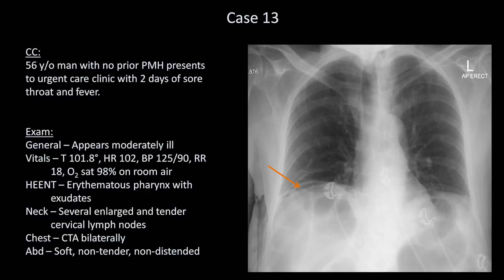It kind of looks like the patient may have free air under the diaphragm, that is, pneumoperitoneum, which is often indicative of a surgical emergency. The first clue that this is not pneumoperitoneum has nothing to do with the X-ray, but rather the clinical scenario. The patient is not presenting with any abdominal complaints. So what's going on? Look in the right upper quadrant of the abdomen, where there is obviously a lot of gas. Do you notice these lines here?